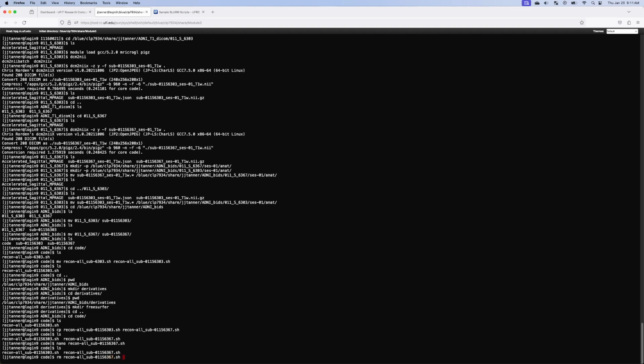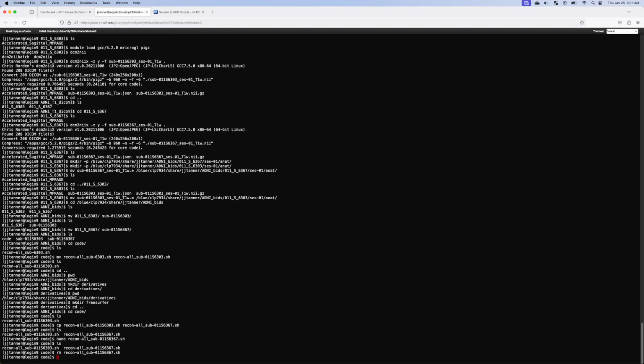Don't do this unless you really want to delete it, because it's gone. But in my case, the other one has both. I'm going to run them. I'll just run one at a time. That's fine. So I'm going to get rid of that.